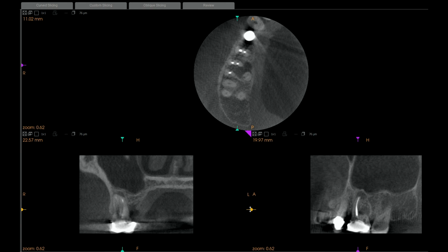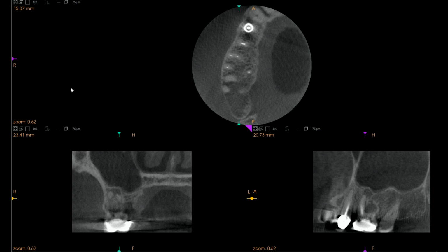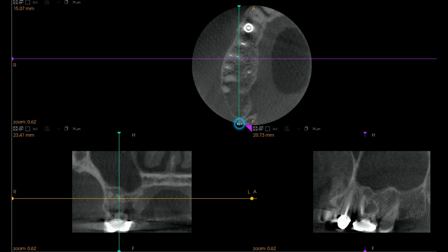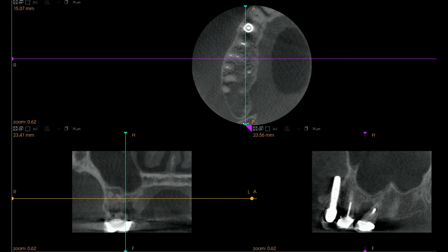The whole reason for this video, however, is to show you something I came across completely unrelated to the root canal. Back on the original x-ray image we were looking at, you can see that this patient has a dental implant, and by the looks of it on this image, it seems to be just fine. On the cone beam image, as I was looking at the different layers, I noticed that the implant seemed to be sticking out of her jaw near the top of it. I was totally surprised by this. When I looked in her mouth, I was able to feel the implant under her gums.